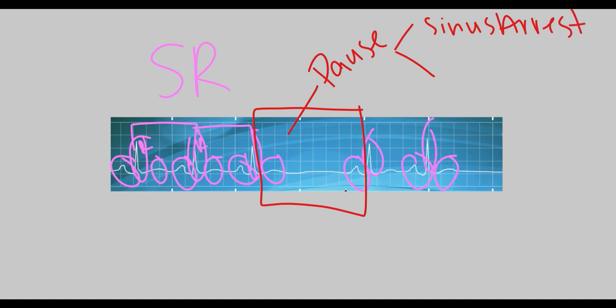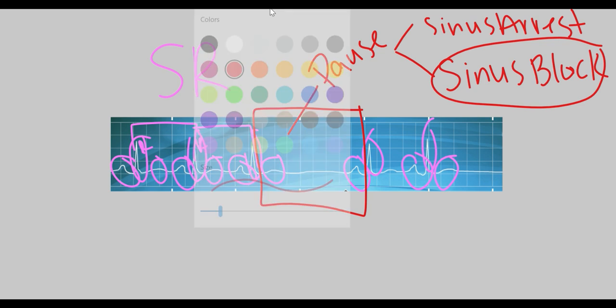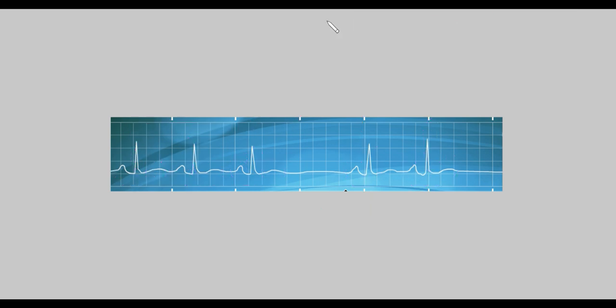And this thing does not write well. And then we have a sinus block. Okay, so we're looking at a sinus block. Let me show you what we would call this in the hospital. Let's delete all this. So in the hospital, this will be called a sinus rhythm with pause.